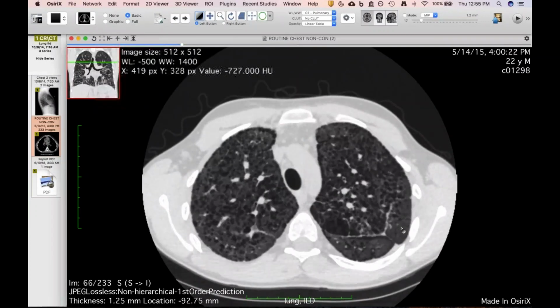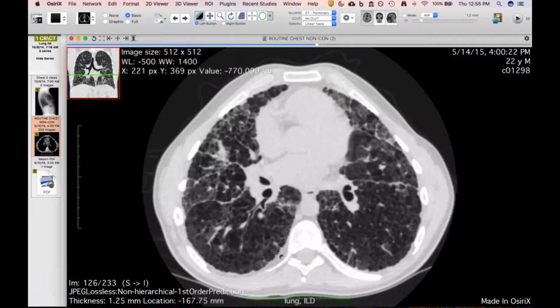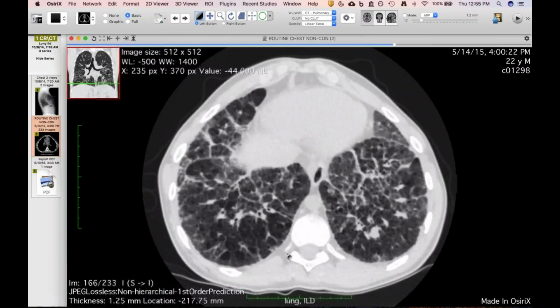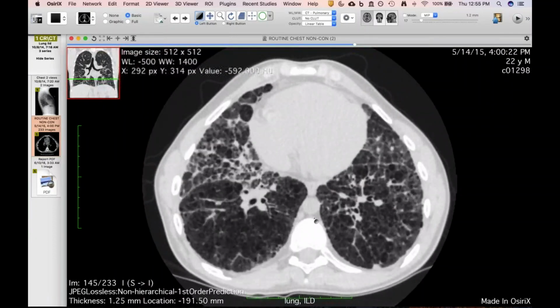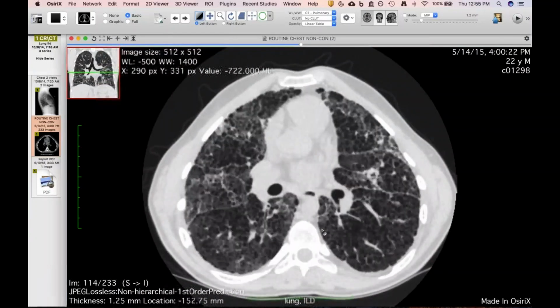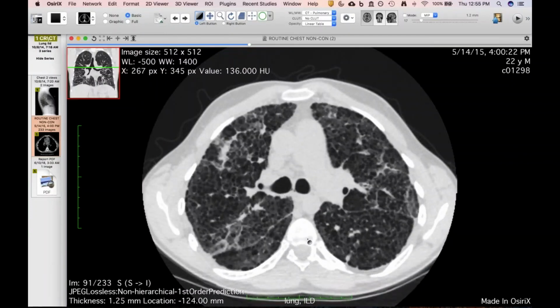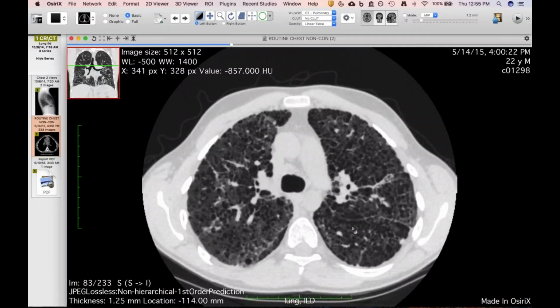This is a 22-year-old, and this is just much more severe. Yeah, whenever we see this in patients of this age now, I've seen a couple of cases of surfactant deficiency that looked similar to this. I mean, it's just a diffuse fibrosing process. But when you also have the arthritis, it's something to think about, in addition to just other regular connective tissue diseases.